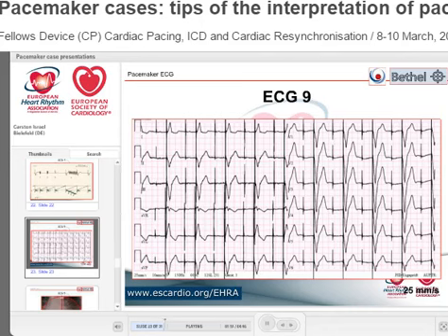Ventricular, the same. So if you look at this ECG, it is, I would say, an AV sequentially paced rhythm, which means atrial paced, ventricular paced. You can also say this is DDI pacing. There's nothing tracked, so DDI pacing. AV sequential pacing at 60 beats per minute.